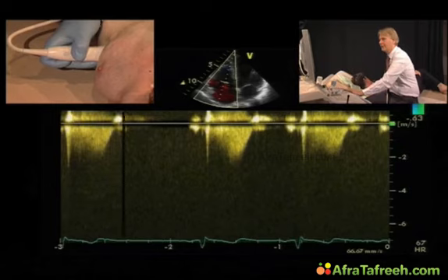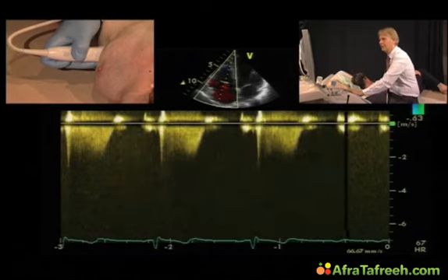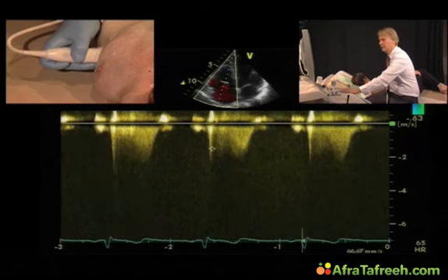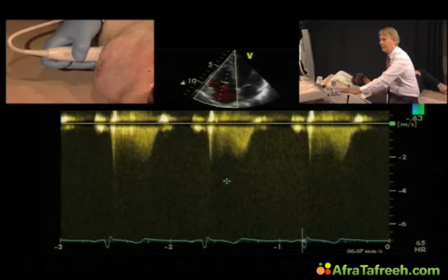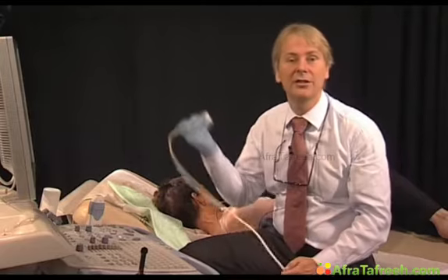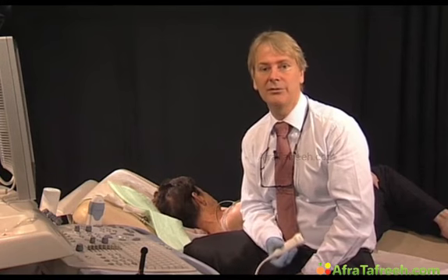What we have here is a spectrum that shows this tricuspid regurgitation, but we do not see how the curve really continues. Now it could end somewhere here, but it could just as well end somewhere down here. So in reality, the pressure that we would then calculate would vary greatly and would give us a large measurement error. So in this situation, I would not measure pulmonary pressure.